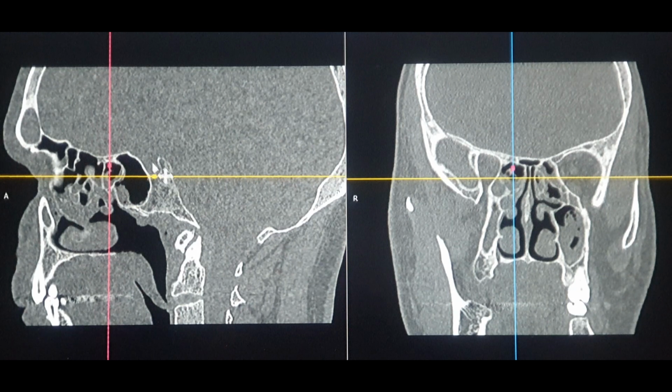That's the pituitary gland over here. That's the process, the three clinoid processes which you can see over here. One of them, this is the middle clinoid process, and the anterior becomes the anterior clinoid process over here. Okay, so actually this is the clivus bone over here. So this becomes the posterior clinoid process. Here somewhere becomes the anterior clinoid process, and somewhere below will be the middle clinoid process over here.